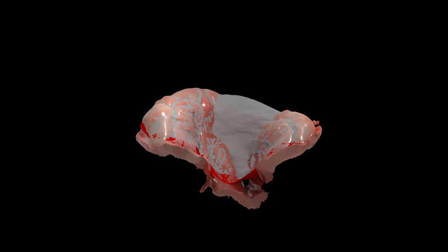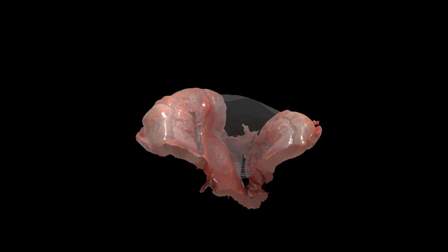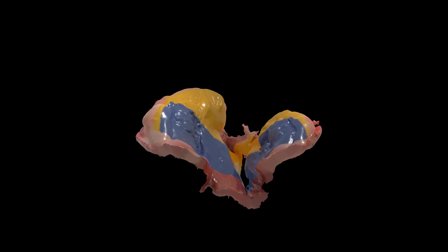We then start our plate generation by cutting the template down to the plate region and smoothing the potentially rough boundary. Before bridging over the palatal cleft region, we approximate the shape of a corresponding healthy palate by fitting a sphere. The optimal sphere minimizes its distance to the dark blue area while not penetrating any colored region.